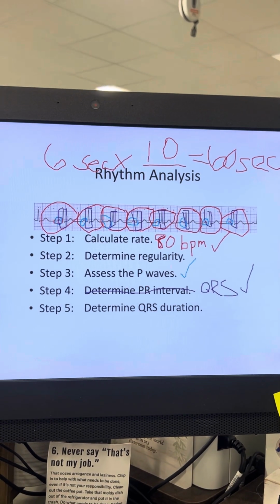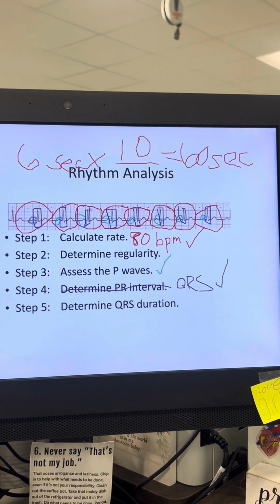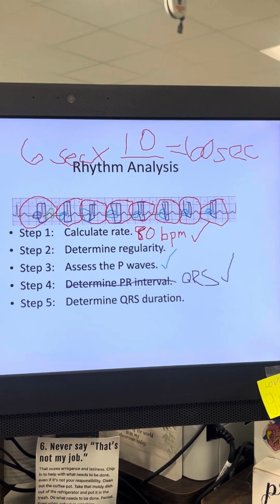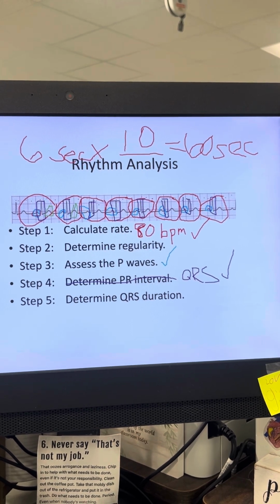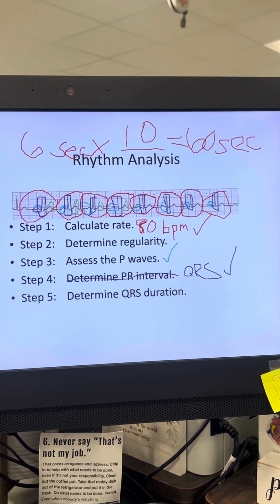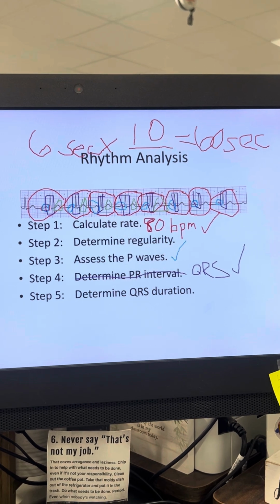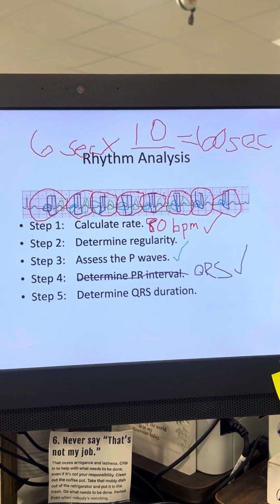Okay, now we're going to do T waves. We're going to draw a triangle around our T wave. And I know this gets bunchy, y'all, and I know this seems redundant, but I'm trying to teach you the process. And this is why when we get some intimidating rhythm strips, we're going to be able to attack them, because you're going to do it this way. The T wave represents ventricular repolarization, okay? And I need it positively deflected, and I need it after the QRS complex.